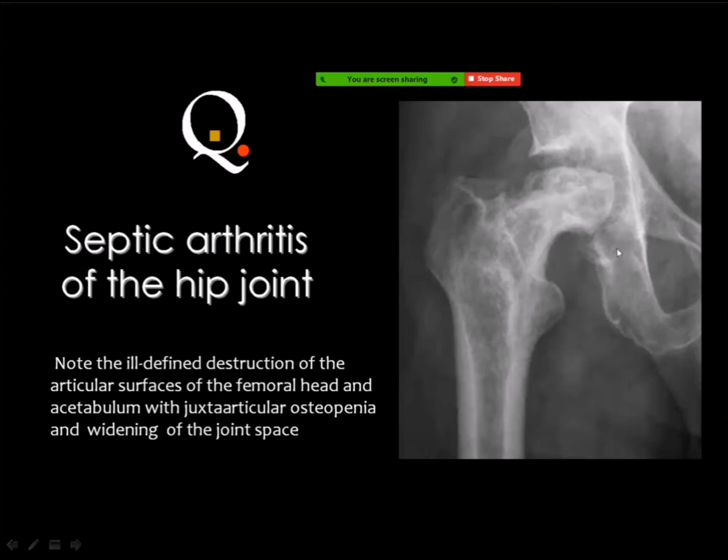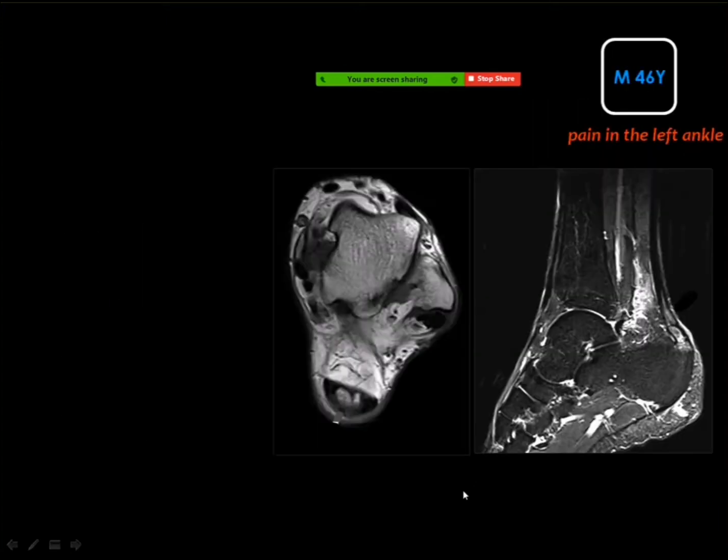And this means that this is an arthritic lesion, not a bony lesion. For hip arthropathy, this is a disease which can be diagnosed when we have two follow-up studies, and we can see the extensive destructive changes in the femoral head in the follow-up study.